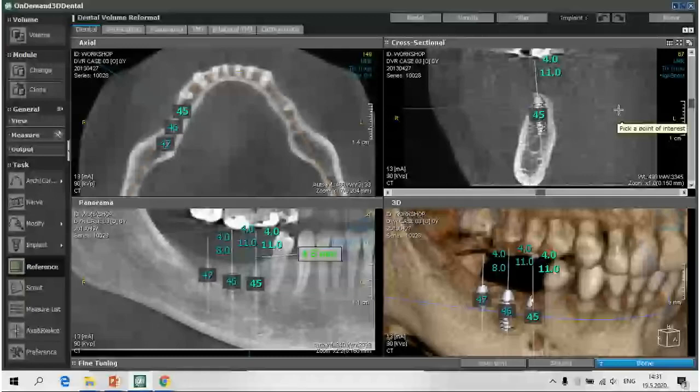So I will try, although the representations of the X-ray pictures here are of a little lower quality than I could assess on my computer. And I hope that we will have the opportunity in the near future to cooperate directly in live interactive workshops, and that we will be able to have much more practice and interaction, and to exploit the maximal capacity of the volumes.